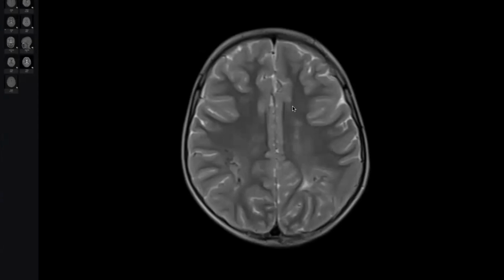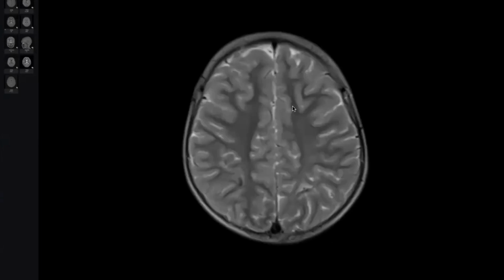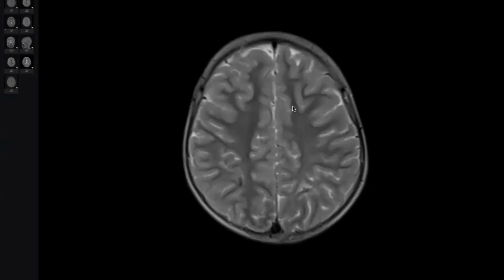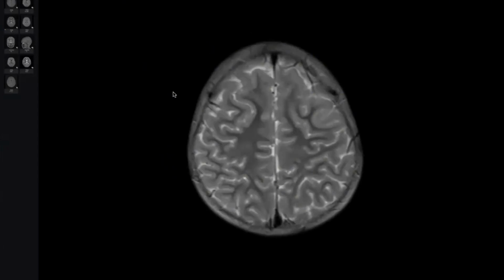My question here: what should you search for in these MRIs? Something very associated with cavernoma. Arterial? No. Venous. Excellent. Developmental venous anomaly. Excellent. Don't worry. You are excellent. No problem. Thank you, doctor, so much. It was a case of multiple cavernoma.